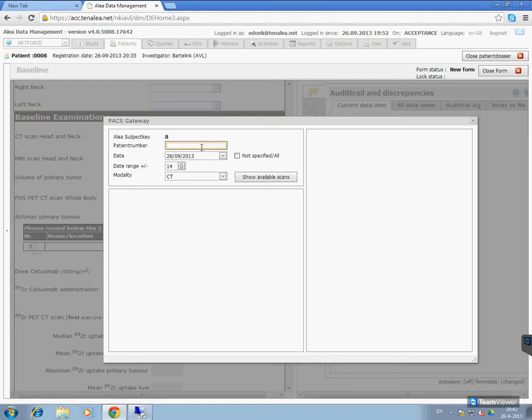The patient number is the number used in the local hospital information system and is not linked with the clinical trial subject key that has been assigned to the patient. This is for confidentiality reasons and for compliance with regulatory requirements. This number is therefore not stored in the eCRF, but it is stored in a browser store where it can be used in subsequent accesses for the same patient.